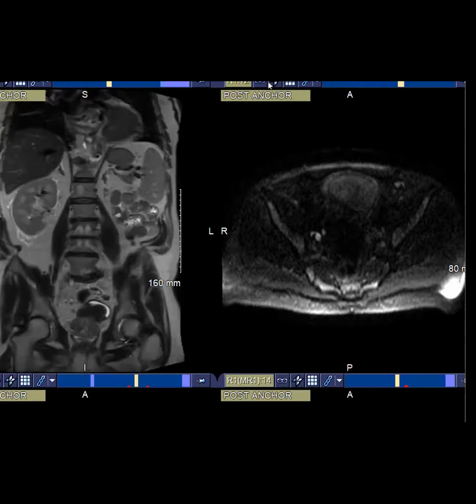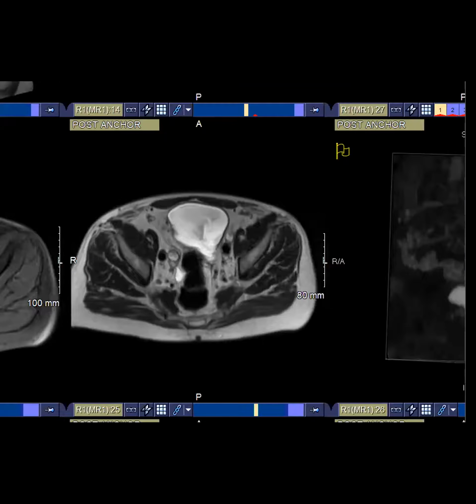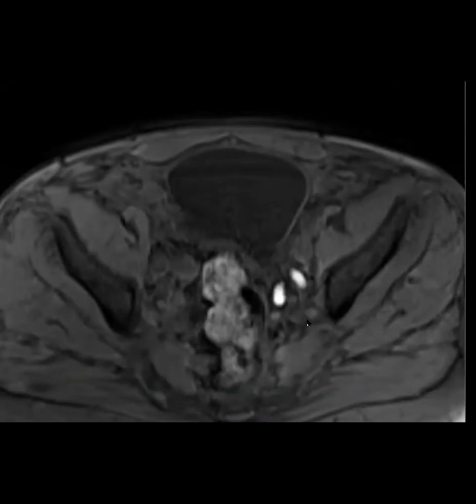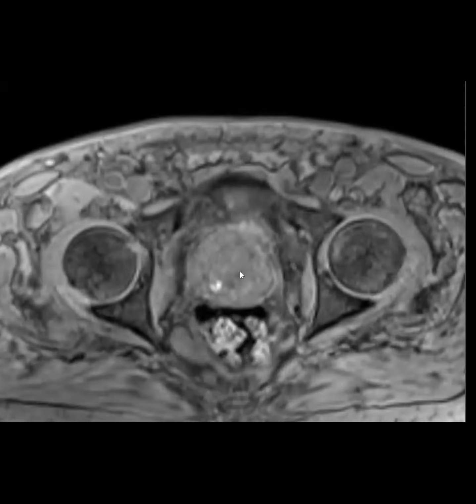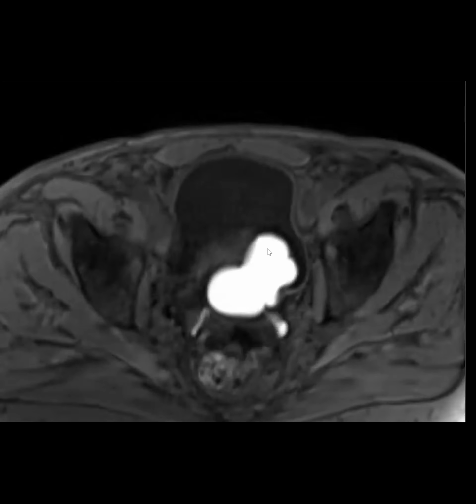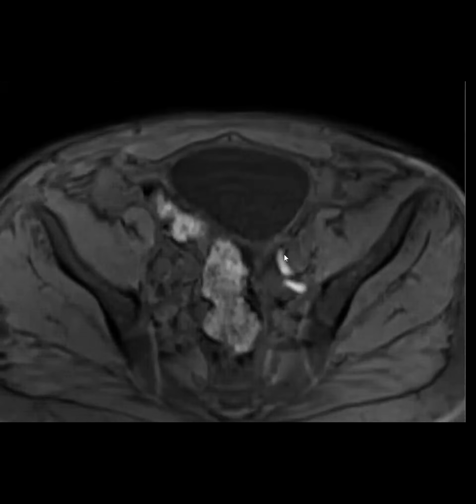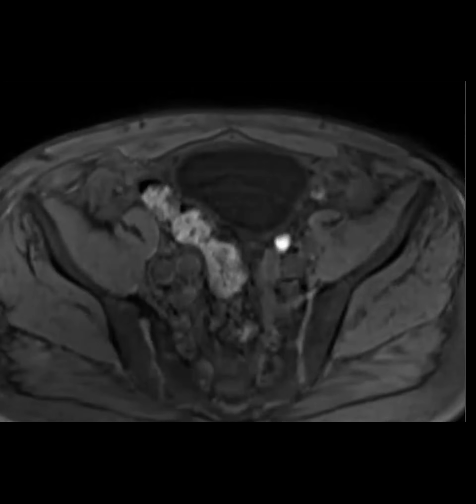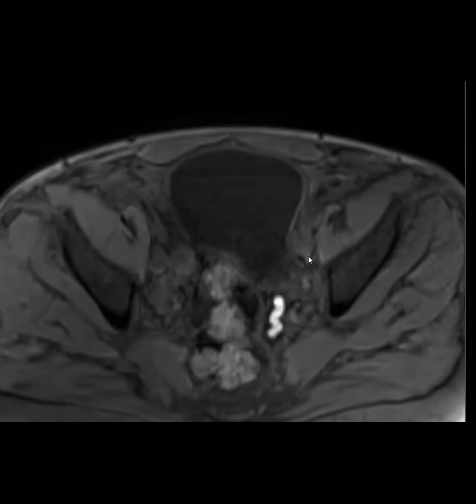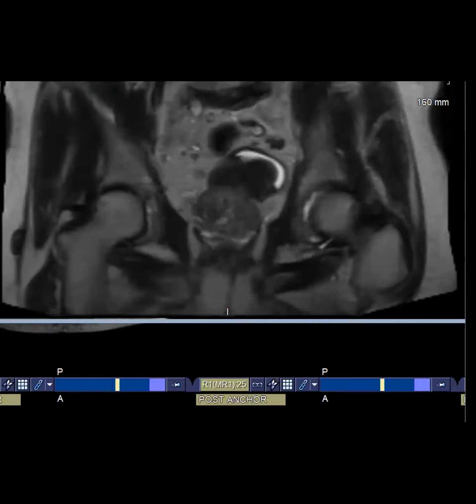There's another finding that goes with this finding, which I showed you on the coronal, and we'll come back to it. Let me show you the axial T1. So this is the pre-contrast T1 axial prostate. Intrinsically bright on pre-contrast T1. And then there is this vesicle, tail-like thing. Somebody's on the right track there, bladder. This thing doesn't enhance on the post-contrast. I'm going to go back to the coronal.